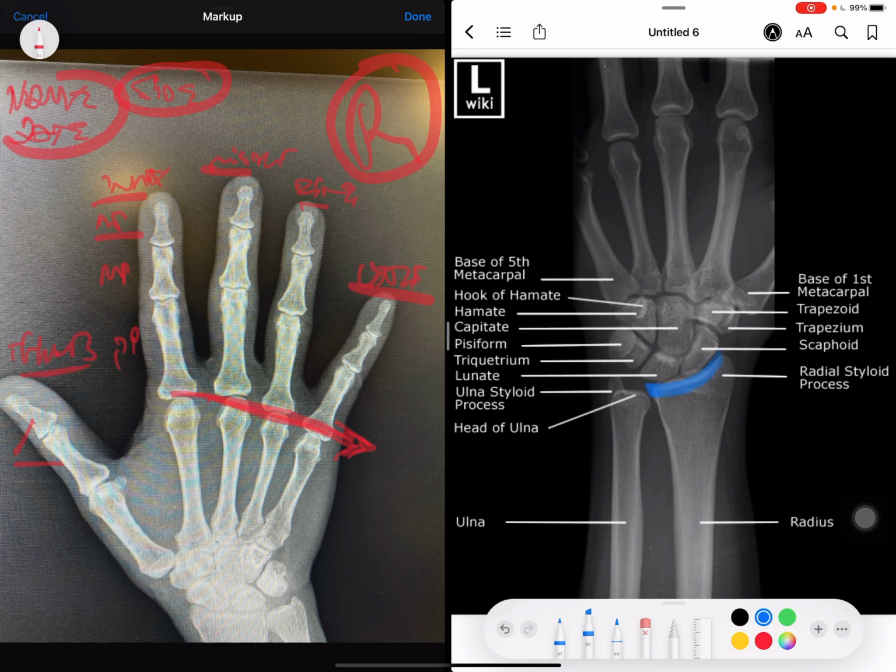So you have a nice curve, slope and curve. It's like a ski slope here in the radius. It's from the ski and you land up on the ulnar. If this curve is disrupted, something is wrong. So if the radius is running short and the ulnar is up, it's called Madelung's deformity. You can look it up, Madelung's.